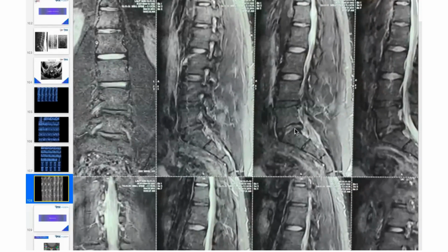Can you see something here? It's getting herniated. Hydrated, but what is that? This is a big tear on the disc, annulus. There's a big tear in the annulus through which nucleus pulposus started coming out. And it is still contained. Outer annulus is still intact.